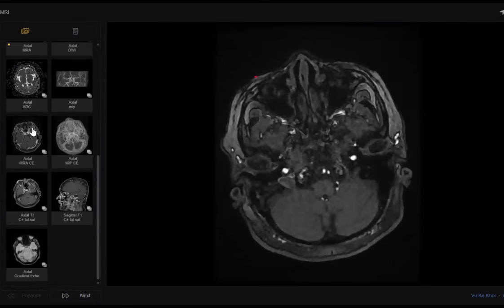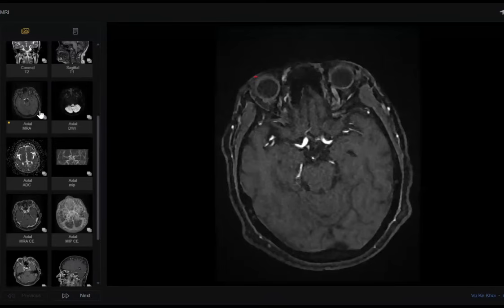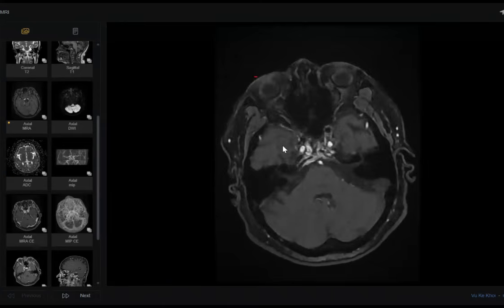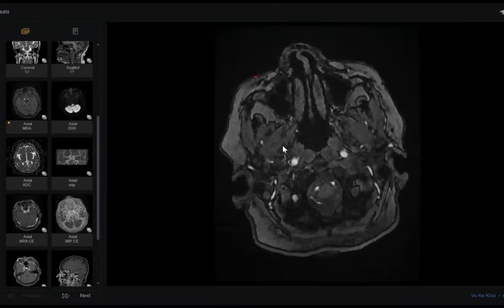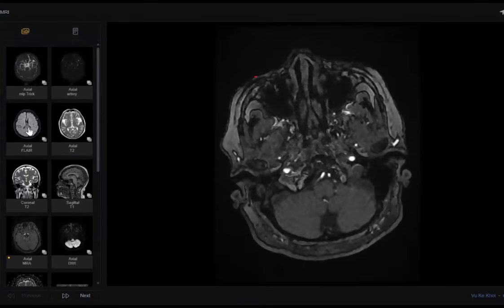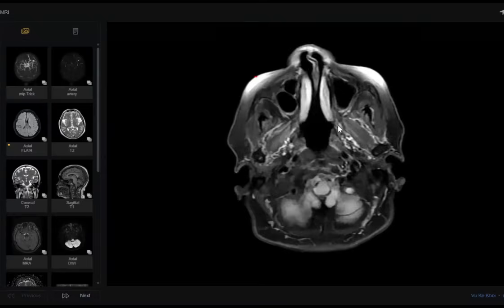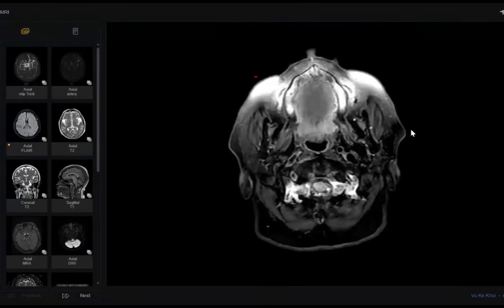When the examiner shows you any one of these angio studies, take care not only of the main arteries. I will tell you many of the tricks and the confusing points. Number one, he may give you one FLAIR, and the abnormality is here: there is dissection or occlusion of one of the carotid vessels. Take care.